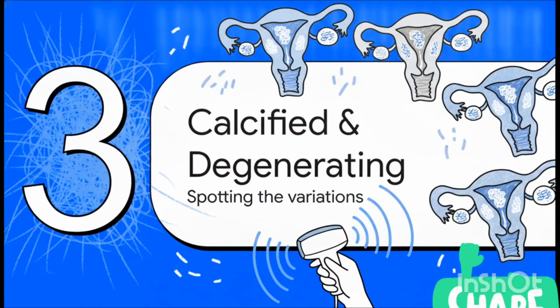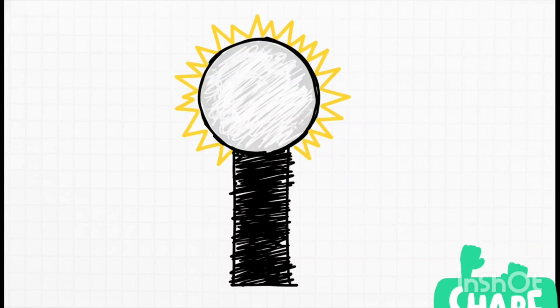Next up, Section 3, calcification and degenerative changes, spotting the variations. Now, fibroids aren't just static, they change over time. As they age, they can become calcified. This creates a dramatic visual shift on your screen. They become highly echogenic, meaning they show up as extremely bright, stark white areas. And since calcium is incredibly dense, you'll see very intense acoustic shadowing right behind those bright spots.